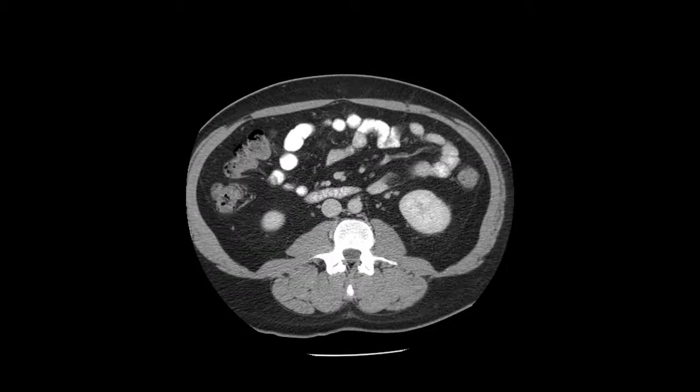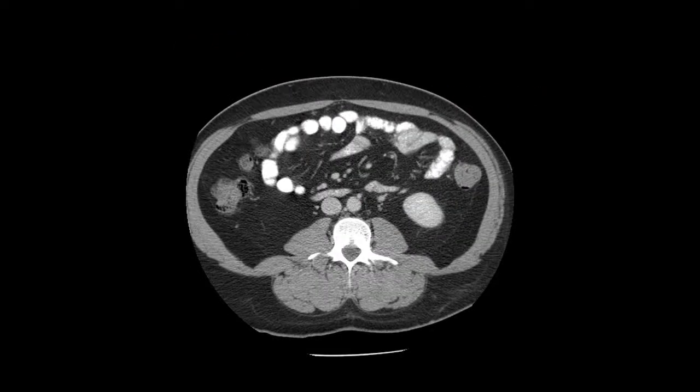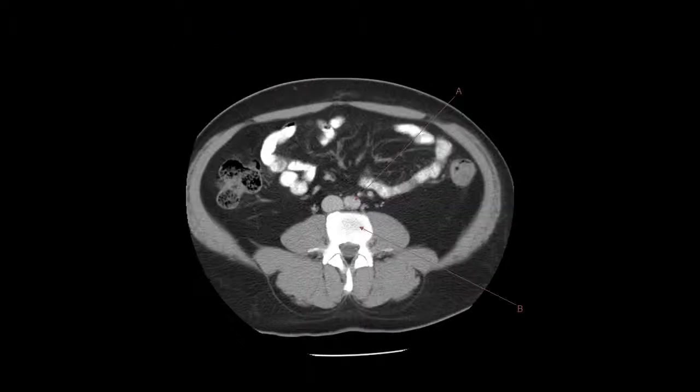Okay, transverse colon still. Keep coming down. Lots of gut, lots of bowel. Here's your superior mesenteric artery, your inferior mesenteric artery sitting right next to the aorta. Okay, so B is vertebrae. What do you think A is? Aortic bifurcation. The aorta still, but let's watch it as we go down a little bit more.